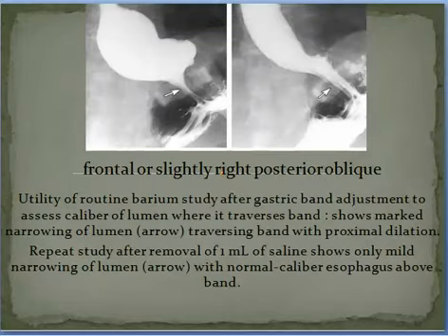Here is the location of the band, frontal or slightly right posterior oblique, showing the band. This one is repeated after this one.